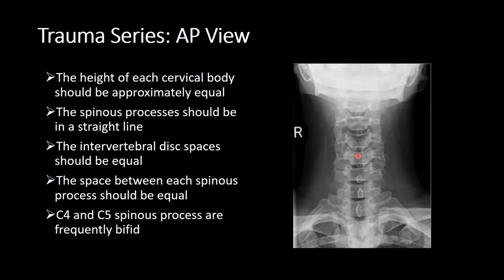Careful, C5 and C4 spinous processes are frequently bifid, and that's normal.